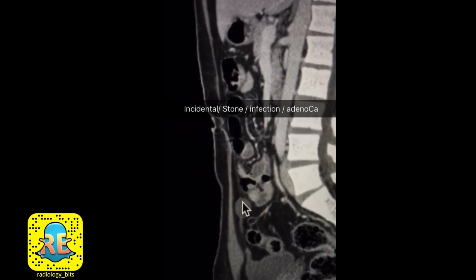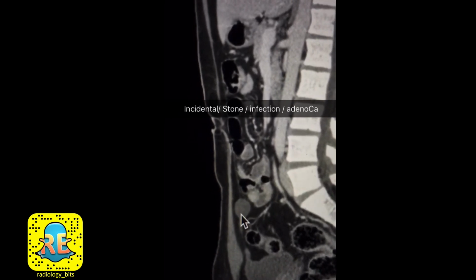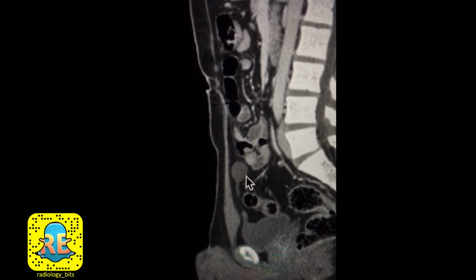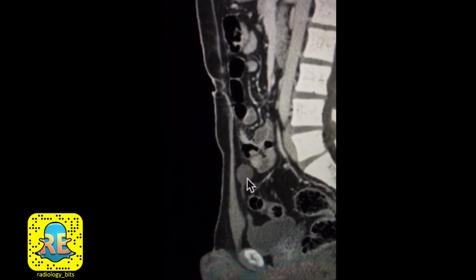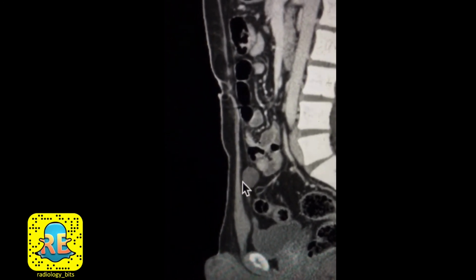In these cases, for seniors, remember that due to metaplasia, the carcinoma that you have here is not transitional cell carcinoma, it's adenocarcinoma. That's why when you check these structures, make sure that there are no soft tissue components, whether a thick soft tissue wall, nodularity, or even calcifications, since that would raise the possibility of either stones or formation of adenocarcinoma on top of a urachal remnant.